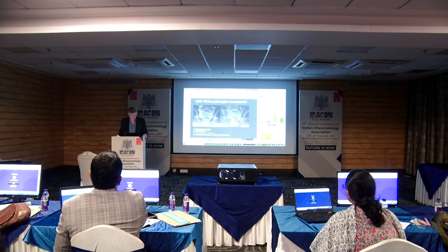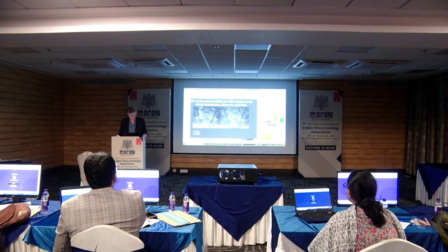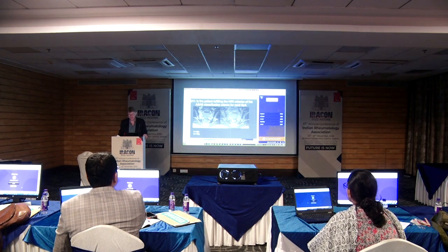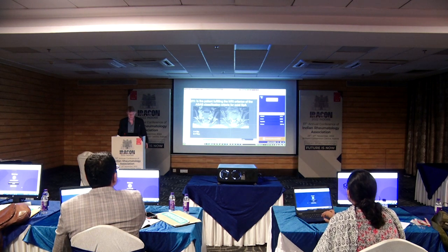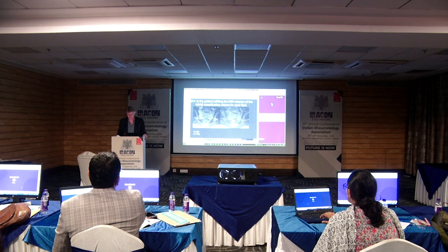Right. Then I'll ask you two questions. The first one is, does this patient fulfill the MRI criteria in the ASAS classification criteria? That's a little bit difficult when I haven't explained to you what the ASAS classification criteria for MRI is, but I'll do that later. But now let's see what you know. It doesn't matter, it's more for explanation.